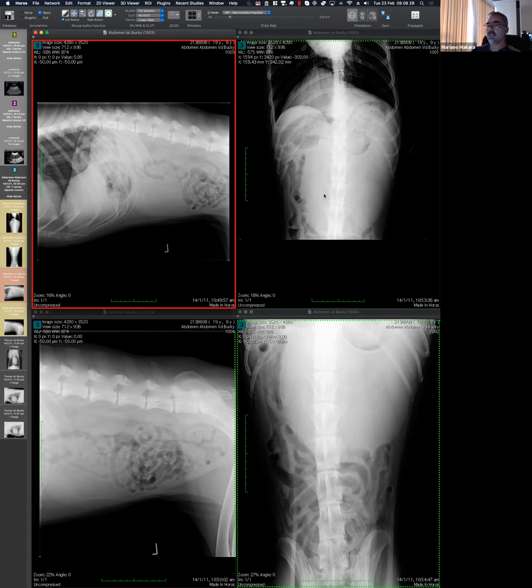But can we try to find what is the best fit in terms of which idea out of these two, mass effect or free fluid, can explain what we see best? I think the mass effect, because the margins seem very well delineated. Okay, so your underlying idea is that that would not be present if there is fluid. Yeah. So that's a feature that is supporting the idea of a mass effect, and doesn't fit the idea of free fluid.